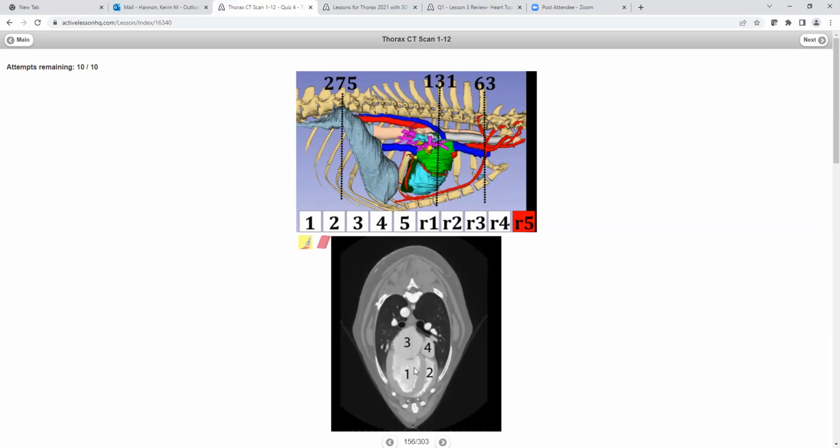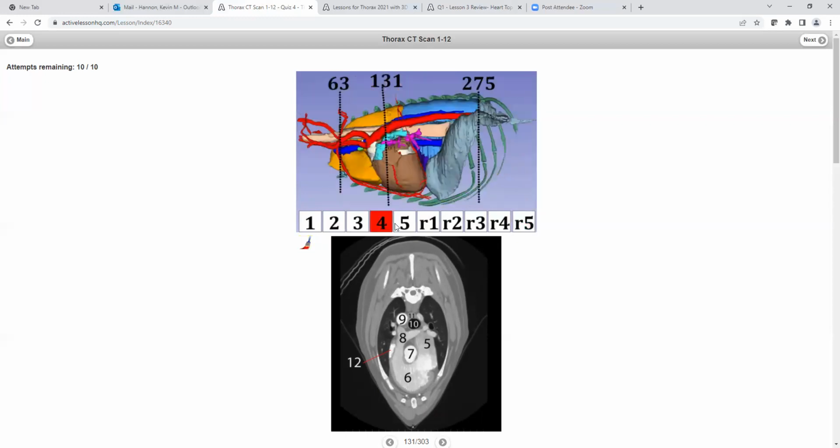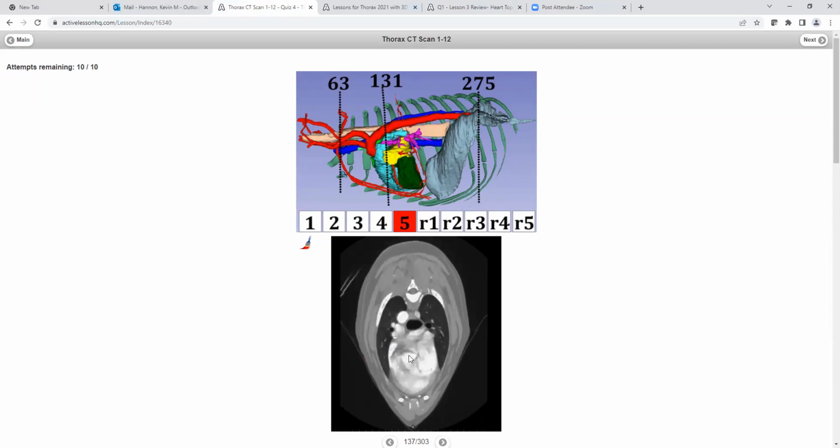So what very large vessel exits the left ventricle? And again, you have to go back to some of the work you did, where you ask, what is a large vessel that comes up from the left ventricle? And we can follow it here, number 7. This exits the left ventricle, and then it comes up.